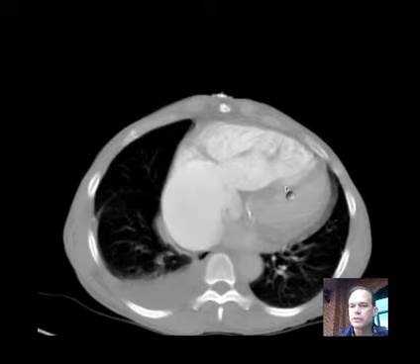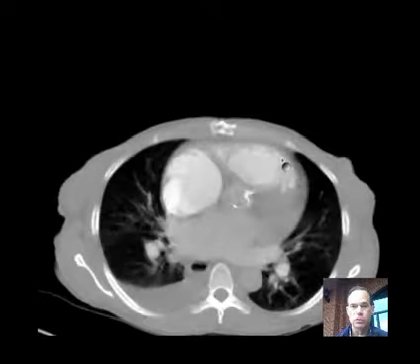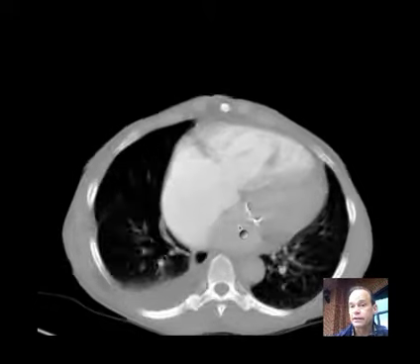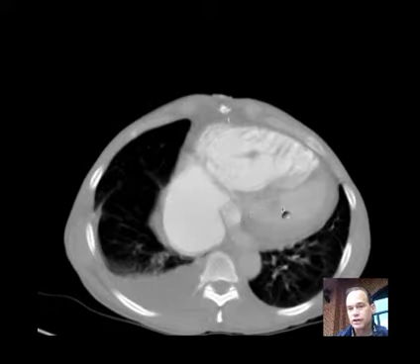But pulmonary embolism causes this displacement because there's so much pressure when this right heart contracts and is trying to push blood past those pulmonary emboli, trying to squeeze by the pulmonary emboli that we don't see here. It can't, and it's encountering so much resistance, whereas the left ventricle has very little resistance. So you get this displacement of the interventricular septum.